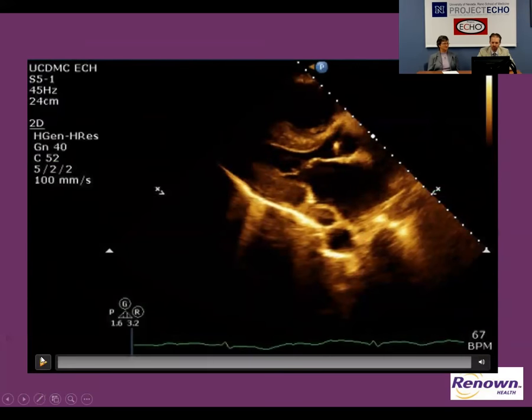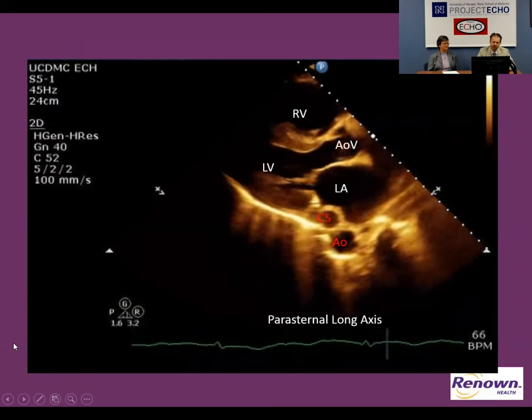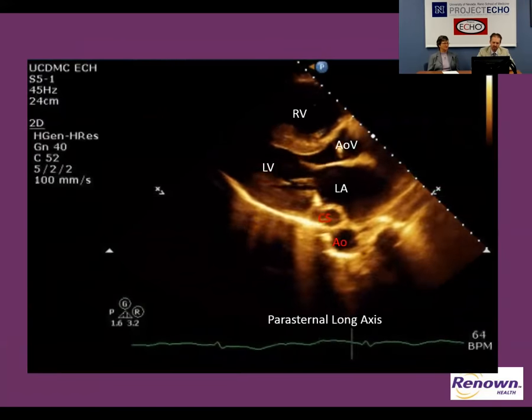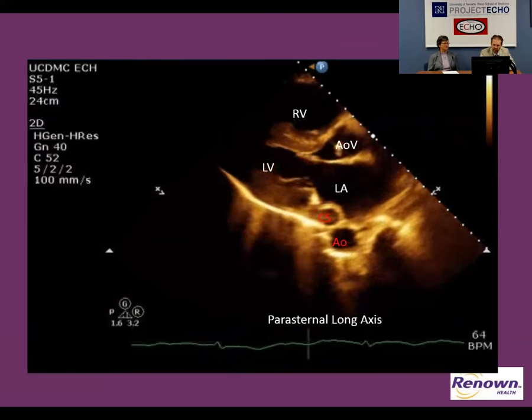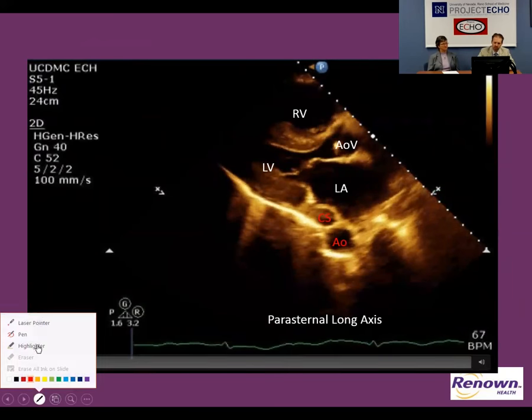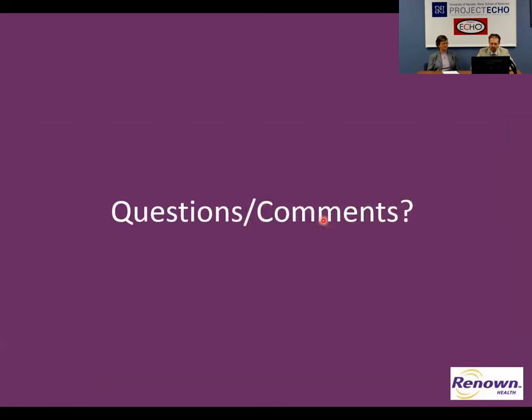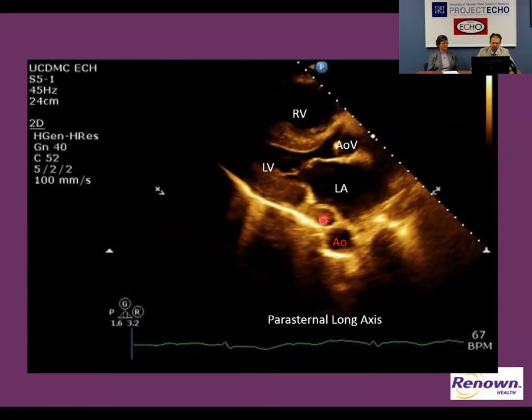And so then this is a curious case because there's a dilated coronary sinus. A dilated coronary sinus can happen with certain embryologic abnormalities, such as a persistent left superior vena cava or elevated pulmonary pressures, which was the case in this situation.